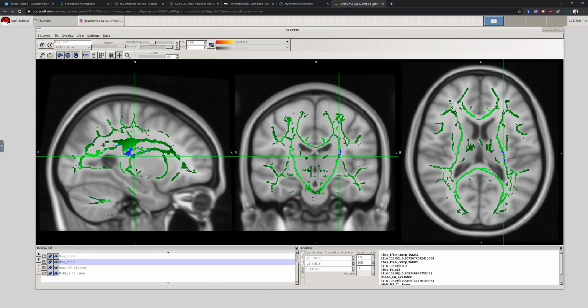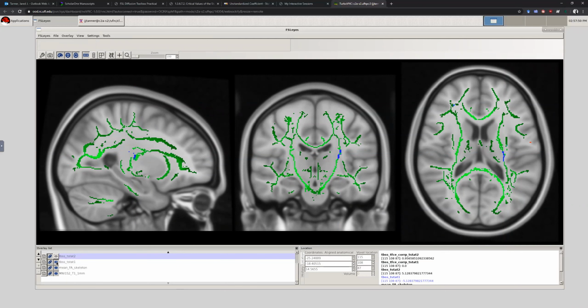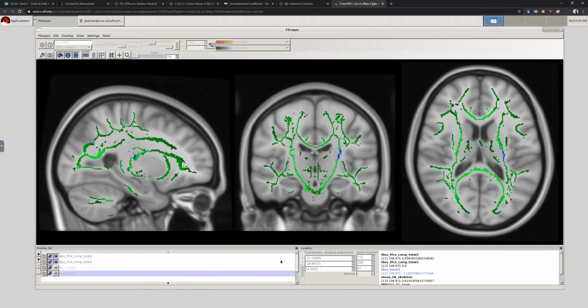So again, you can do a screenshot of this and submit it. If you're spending time to get this for a publication, you would probably do something kind of like that, where you're highlighting it. Again, we wouldn't have these values on. We wouldn't have both T-stat and the corrected T-stat. But we could do something like that and have a screenshot of this. We would save it here with the screenshot, and then that might be ready to be submitted as part of your publication.